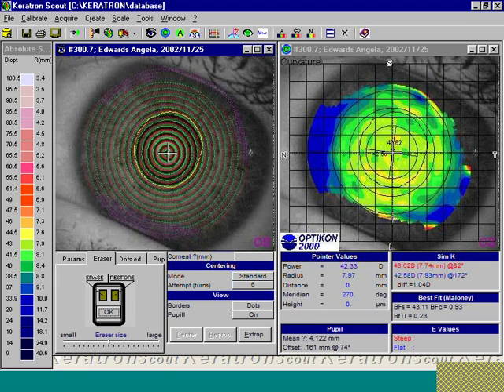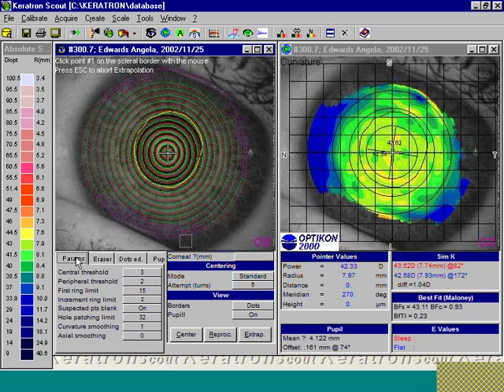If we have a few other areas that we want to eliminate, we can go back and edit a little bit more. Clicking OK and again choosing Yes to get our preferred map. After having edited out the distorted areas, we will extrapolate this map. After clicking the Extrapolate button, click the Parameters button and place the cursor on the screen in about this area, here, and finally at this location on a broad area out on the sclera to extrapolate our data.